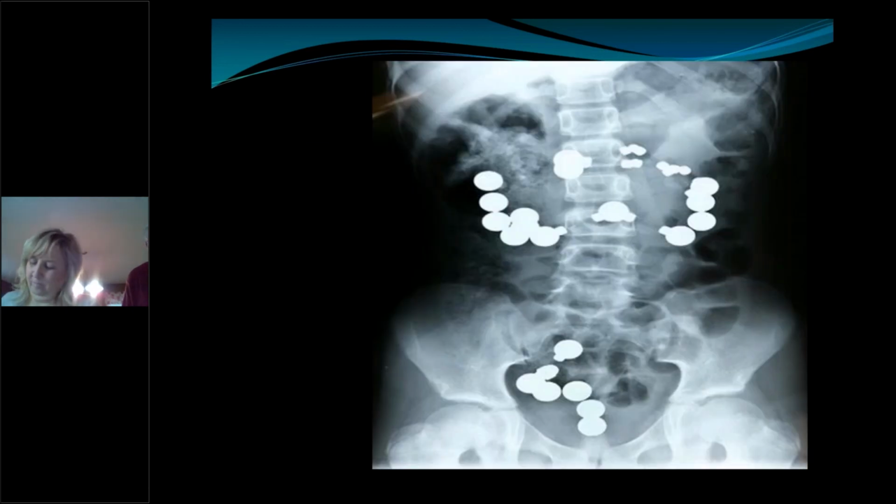So here's a good picture of just a regular patient. Again, we see these white, dense areas. We see these lighter white areas, but not quite as bright as this, which is consistent with an organ, in this case the liver. Obviously, you see some bone. We see some of this cloudy stuff, which is going to be more stool. And then we see this really dark area, which is bowel gas.